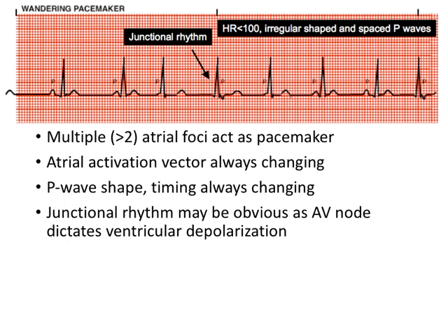There's only one small change as we move to the next example. So varying durations and spaces of P waves, often different shapes of the P waves. You'll also notice the rhythm is not exactly consistent. It's a bit irregular. There are faster beats here, slower beats here. And because of that irregularity, sometimes you can confuse this with atrial fibrillation, our third example. When we get to that example, I'll show you why it's not obviously or easy to confuse.